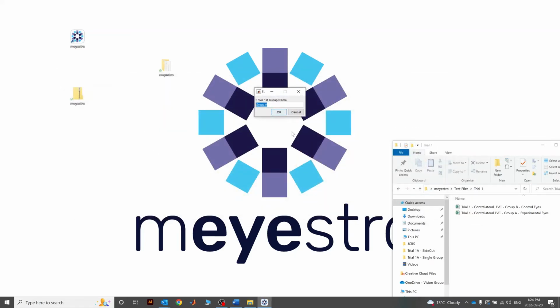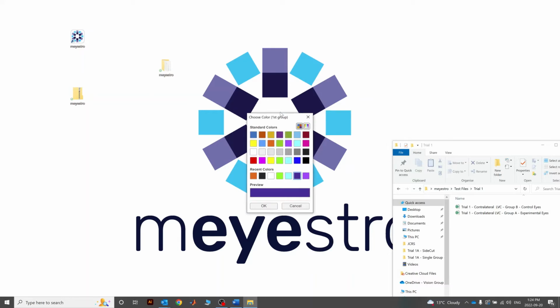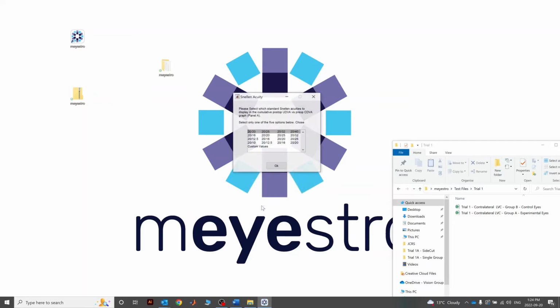mEYEstro will then ask you the group names. Let's use the default here, so group A for the first group and group B for the second group. mEYEstro then asks you to select the color of the graphs. We will be using the standard default value, which is purple for group A and orange for group B.